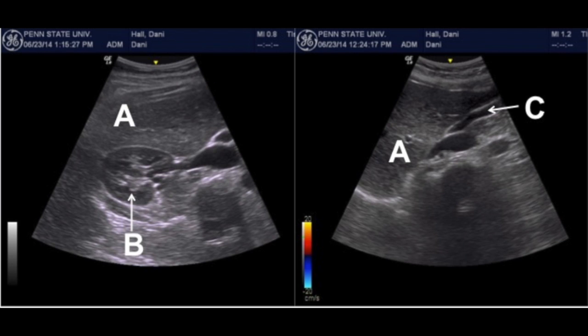waste. And also in structure C, on the right side of the image, the gallbladder, you can literally tell that it's just an open cavity inside the gallbladder, and the function of the gallbladder is obviously to store bile. So a cavity just allows the gallbladder to store more and more bile.